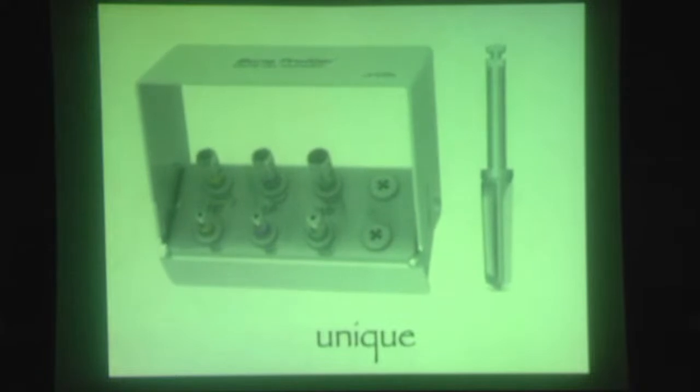And this is unique for Dentsply Sirona MIS. Look, in this era, we don't place the implants at the bone level. We place the implants subcrestally, around 1.5 or 2 millimeters. Think that you place the implant subcrestally.